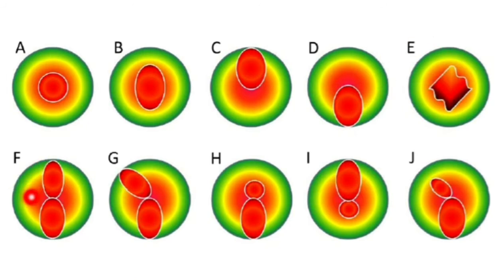Another thing is the symmetric bow tie pattern, and this is a symmetric bow tie with skewed radial axis. This is an asymmetric bow tie with inferior steepening, and this is an asymmetric bow tie with superior steepening, and this is an asymmetric bow tie with skewed radial axis and inferior steepening.